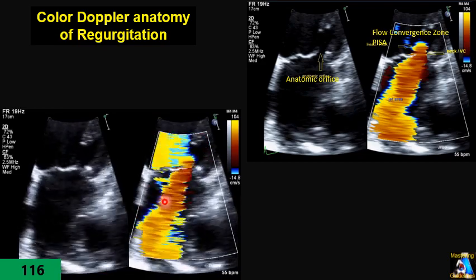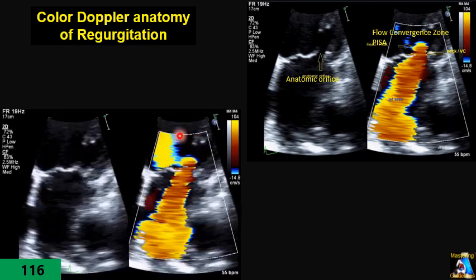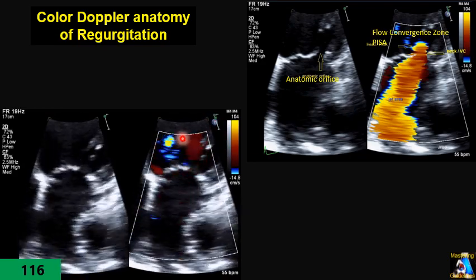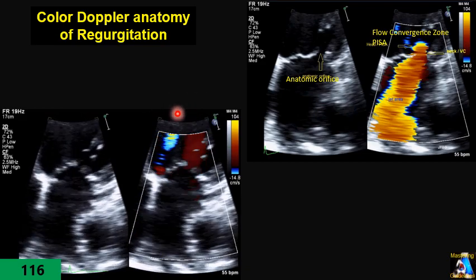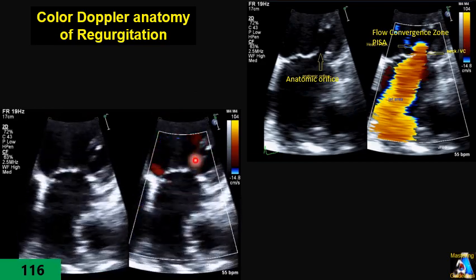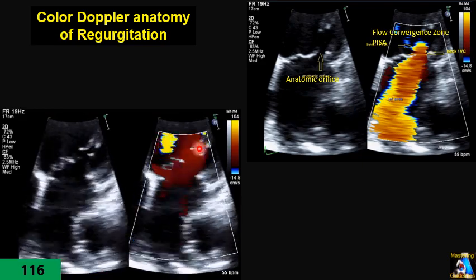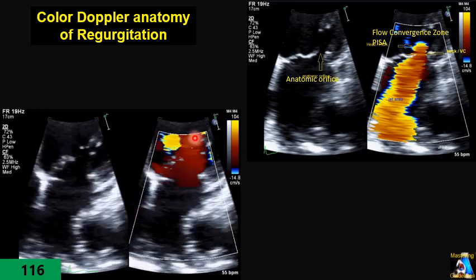The first component of the jet is proximal to the orifice, a circular shape that results from the convergence of the blood flow, pushed by the left ventricle, toward that area. When blood converges more and closer to the orifice, at a specific moment and distance from the orifice, it shapes a circle in 2D and a sphere in 3D.